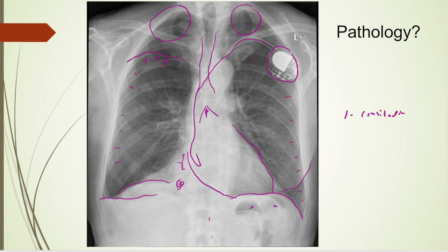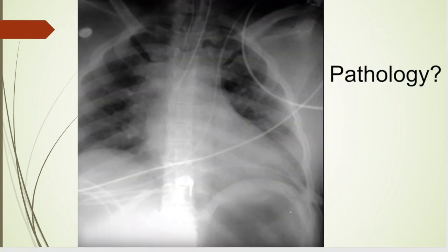So this patient has an effusion, possibly consolidation, and a pneumothorax here on the right-hand side. So I would say that he is going to be getting a chest tube. So pleural effusion as well as a pneumothorax. That was an interesting chest x-ray. So on to the next.